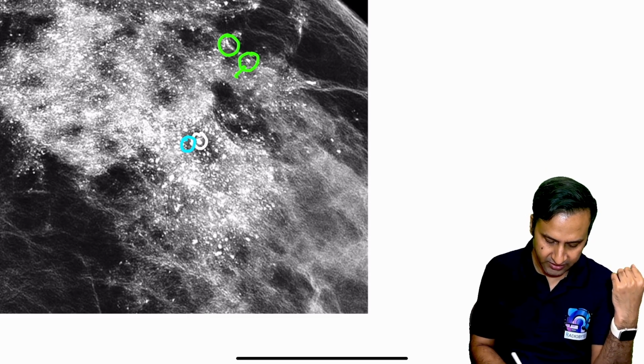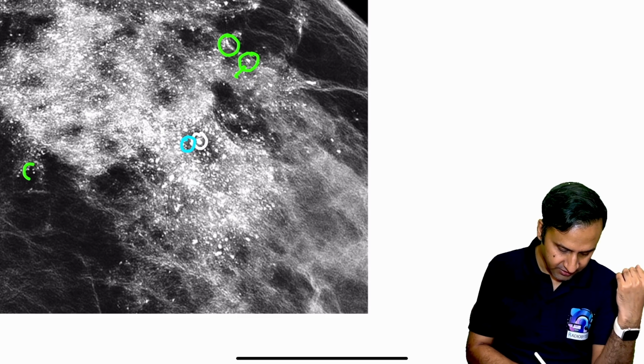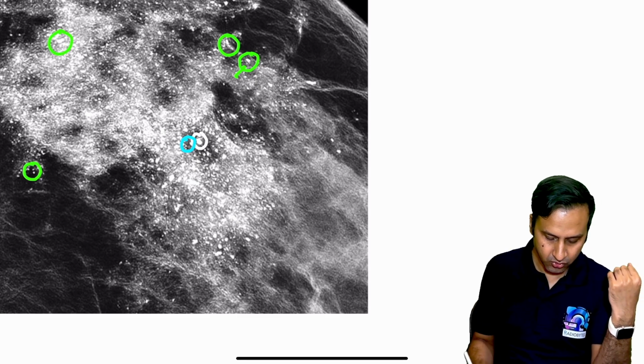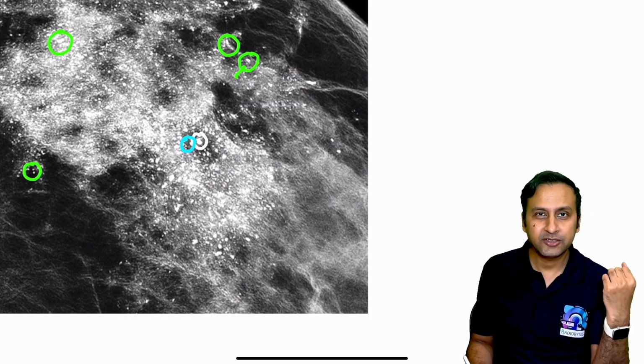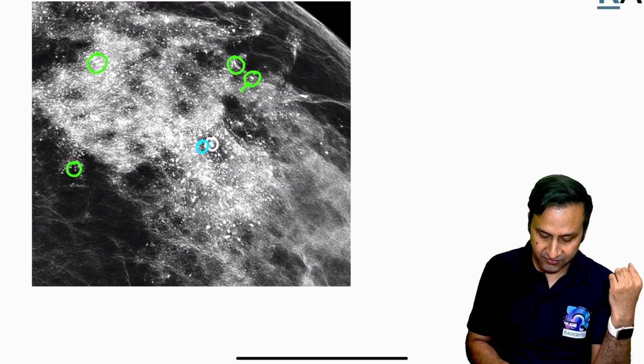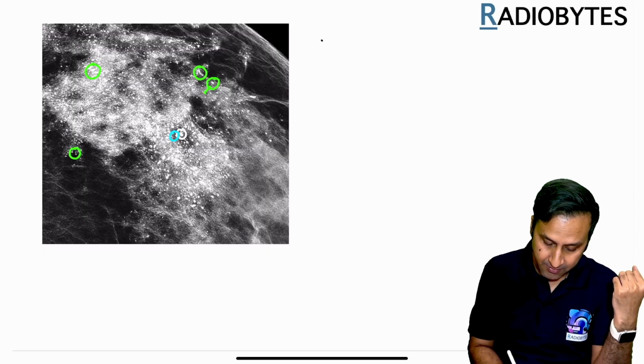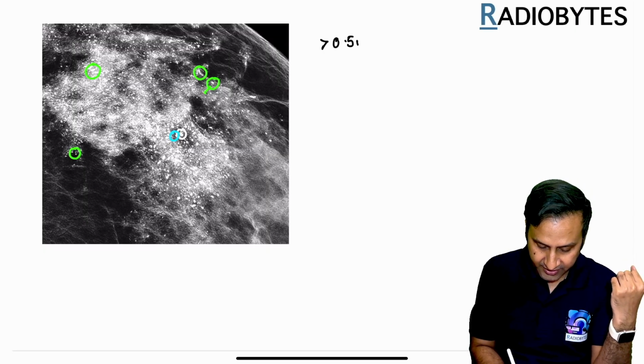They look more of a triangular nature. Some again look thin punctate here. Then here some look like linear, but they're not linear. They are rectangular in shape. So these type of calcifications where we see more of heterogeneity, but they are more than 0.5 mm, are called coarse heterogeneous calcifications.